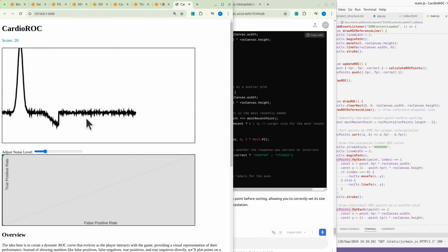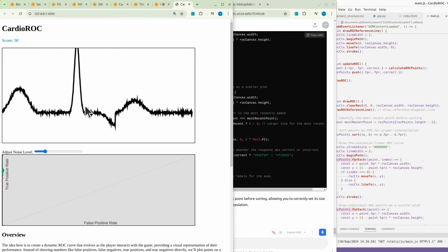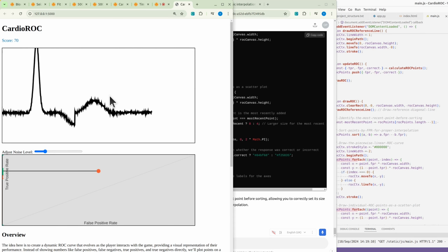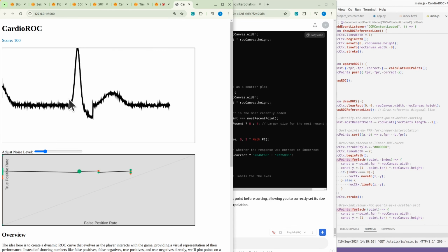Yeah, we have a correct response and now a correct response. We won't click on that just to get a red. Yeah, green, and it's larger, that's fine. Now a green, larger, it's fine. Should get a red if we don't click on this. Green, that's fine. It's becoming faster when you get to 50 points. Okay, we don't click on a normal ECG waveform, so we get a green response as well. And we need a normal ECG waveform to actually click on it to get, yeah. Okay, now if we're going back, so if we don't click on this, red, green, okay, green, and it is larger, so that's looking good. Green going up.